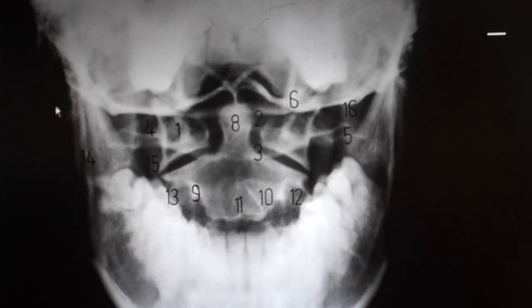It will be a cloudy, bubbly look because the mastoid process has a lot of air cells. Number 8, easy to see. Number 8 is the odontoid process. Goes all the way up to here, and of course here is the other side. So all of that is the odontoid process.